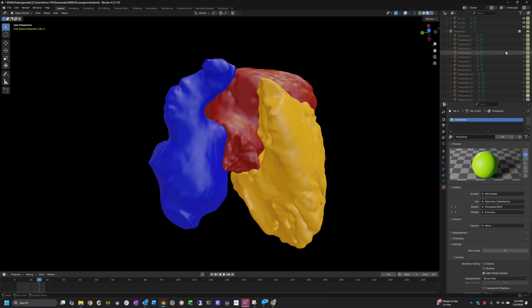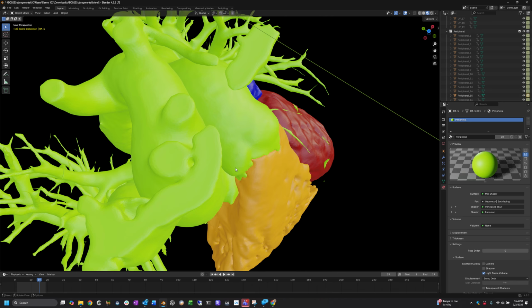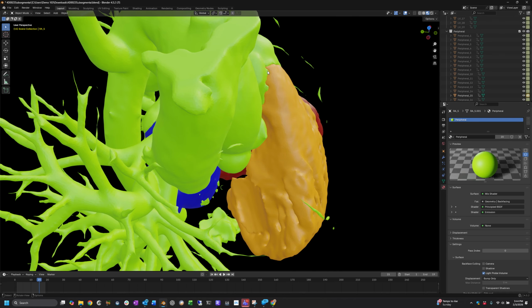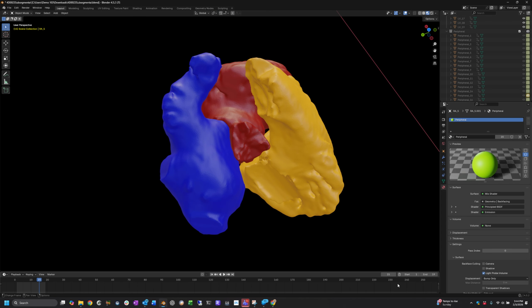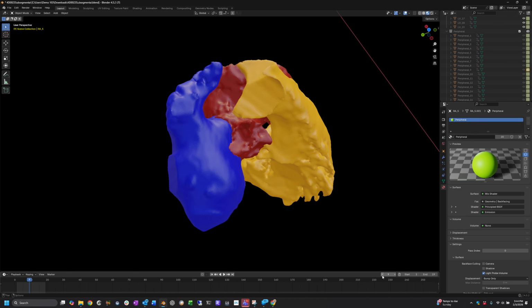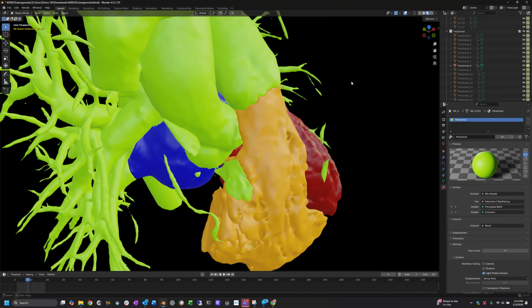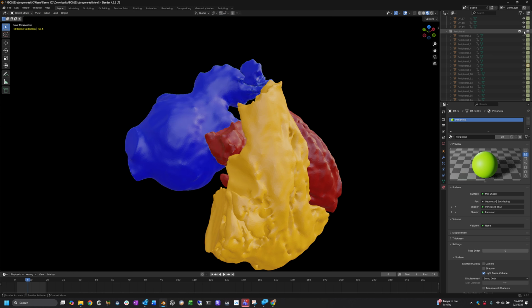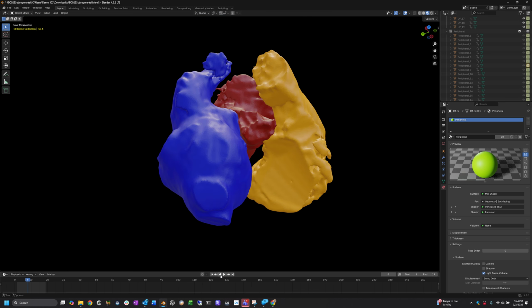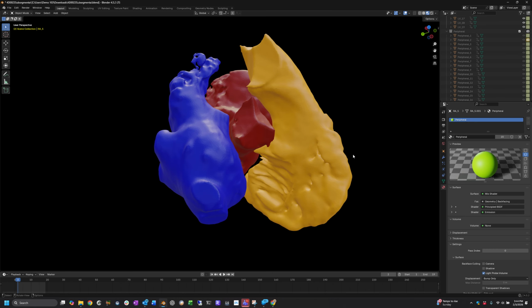If I put the peripheral back on, yeah, see how I can see that it was a little, that may have been an early case. But I think the pulmonary valve, again here, yeah, we can see how those may have been some of the early ones. I think those will get averaged out, and we don't need to go chase that down before putting these into the library. But I do like this one here.